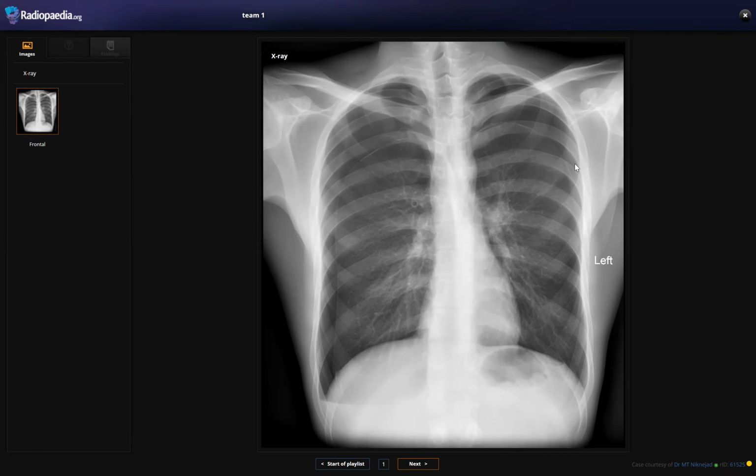So I have been provided with the chest X-ray frontal projection of a skeletally mature patient. The most striking abnormality that I can see is bilateral pneumothorax, and there is also a fluid level on the right side, so it's hydropneumothorax on the right side. The cardiomediastinal shadows appear to be normal. Bilateral hila appear to be bulky, but as there is a pneumothorax, there is crowding of the vessels and lung parenchyma.